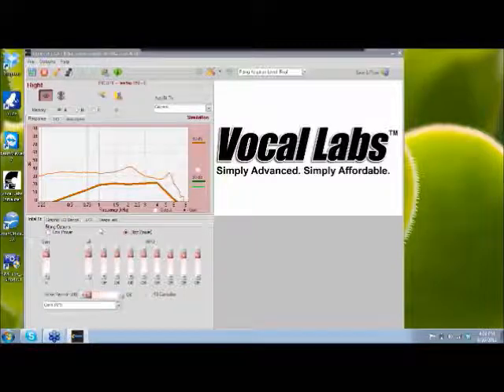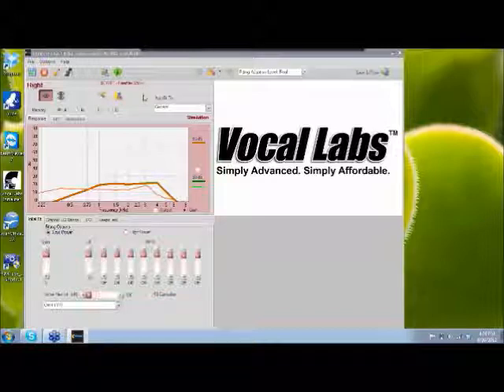The other thing is, once you pick it the first time, it'll be saved every time after that, unless you change what type of speaker you're using, then you have to manually change this again. So first thing, make sure your fitting options are correct. And that will be up here as well. When you change to low power, the readout that you have up here of what you're working with changes to low. When you change to high, it's back to high.